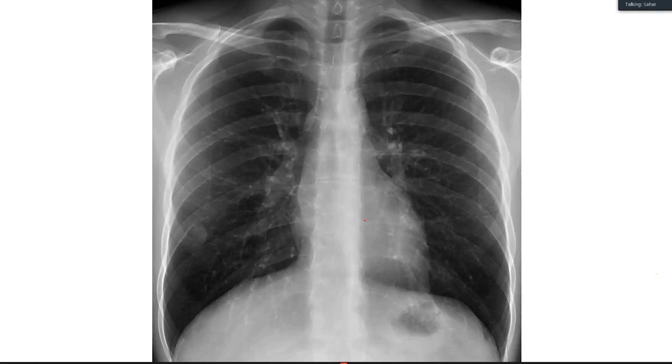Sir, if it is an artery or any vessel, then a feeding vessel or some sign should be there. Not necessarily. You might see something, a shadow, an aneurysm, for example. Even sometimes with big aortic aneurysms, you cannot see shadows or feeding arteries. So it's a rare thing to have an aneurysm coming from the intercostal artery, but it's not rare to have a neurofibroma, is it?